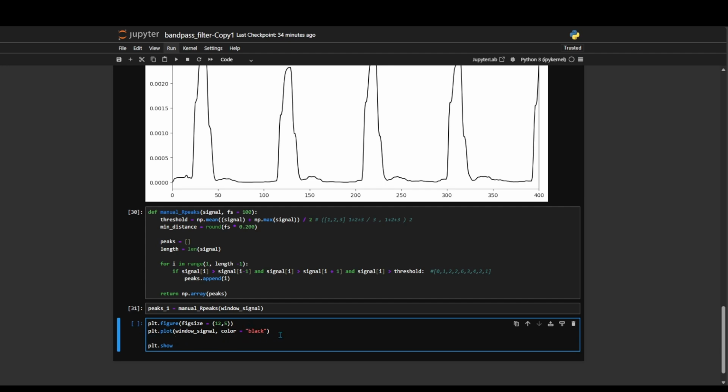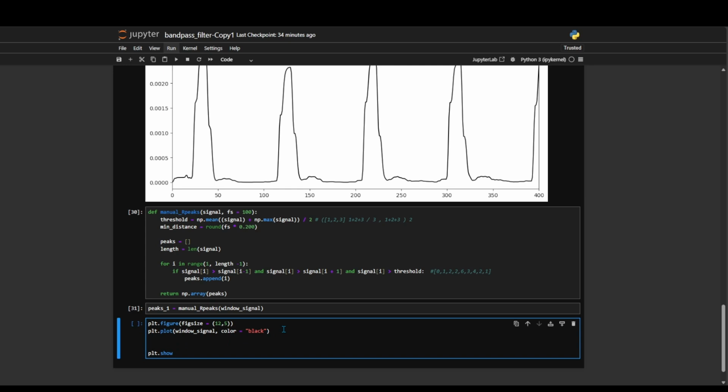We will display them as lines. We have our peaks. Color red. Okay.